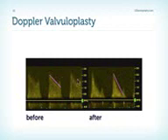In addition, you can see that the slope of the curve has also changed, so the pressure half-time has significantly decreased. Even if the mitral valve area, which we calculate with the pressure half-time, is not exact, we can see that there actually is an increase in the mitral valve area.